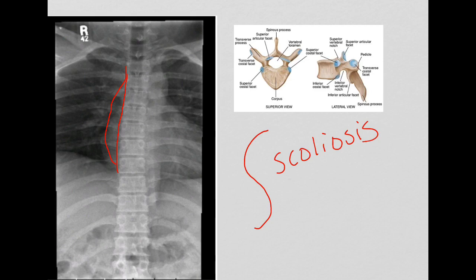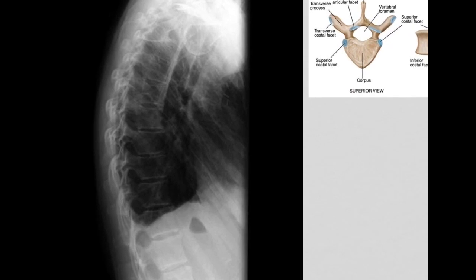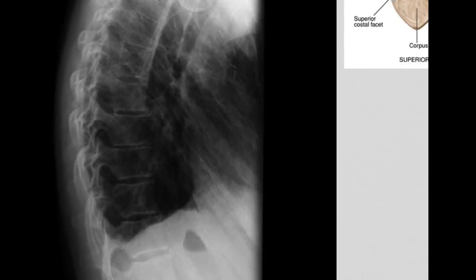Okay, we are going to move on to the lateral view. And I'm going to zoom in for this a little bit. We're going to go over those characteristics that all vertebrae have that we've already identified. We'll go through this a little bit more quickly. All right, so we've got vertebral bodies here and here. Coming right off behind the vertebral bodies, this little area here, those are going to be our pedicles. So here's another body. There's another pedicle area right here.